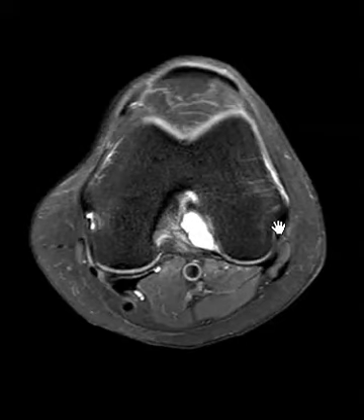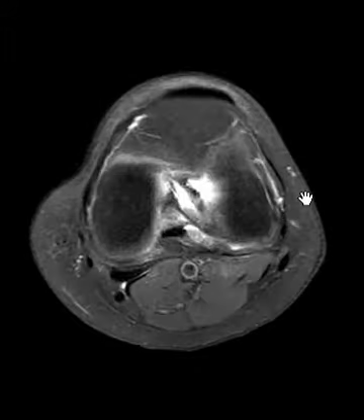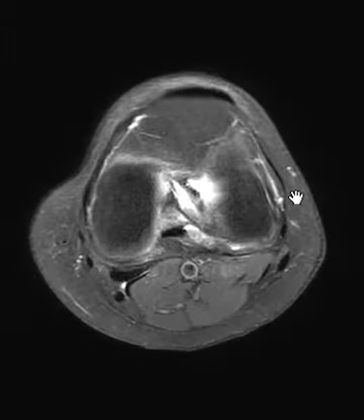Hello, this is Dr. Gay from First Look MRI, and this is a 51-year-old female with complaints of knee pain. There's been no prior injury, no sports activity, just pain for the past couple months.